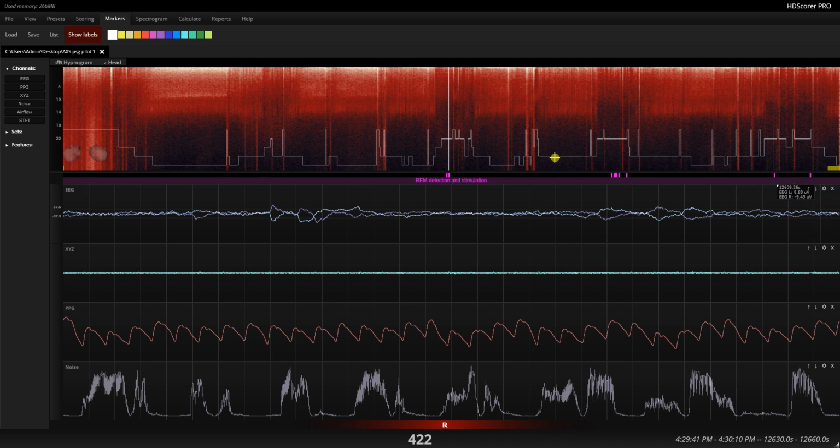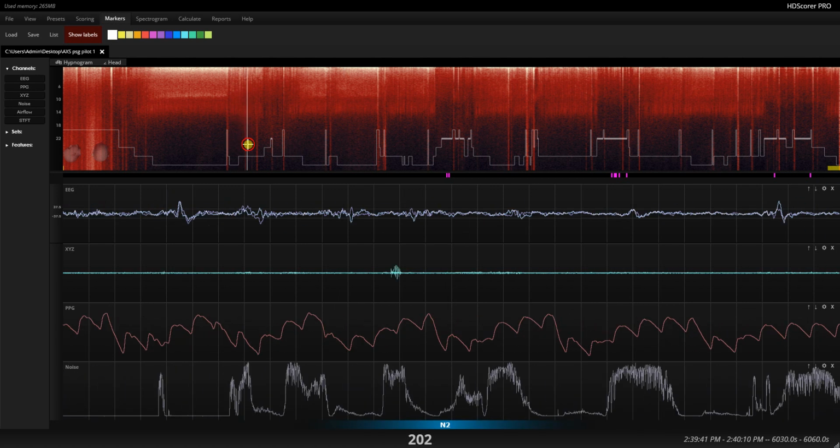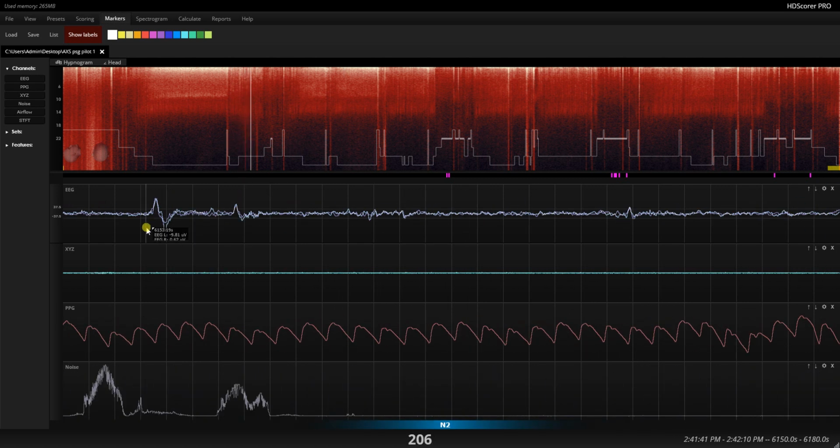The reason here they're whole epochs is that online REM detection, as used in the lucid dreaming functions, is something that identifies REM based on the epoch. But there's no reason to be limited by that. Let's say I find a feature that I want to highlight. For example, a K-complex. I'm going to pick a color, let's say cyan. For some reason it got associated with K-complexes as I was developing the interface for the previous version of this. Now if I click A, it allows me to add a new marker.